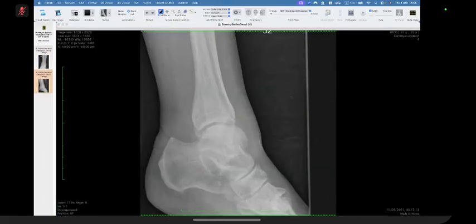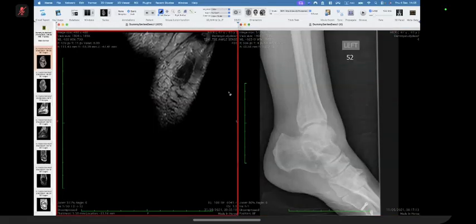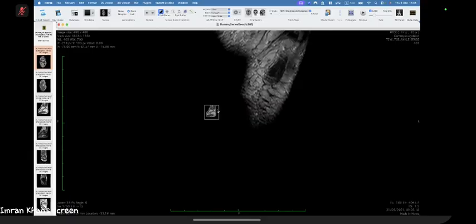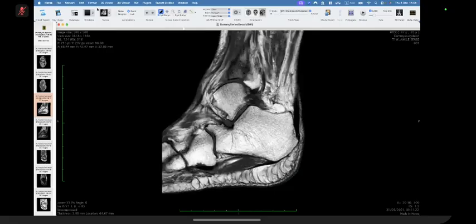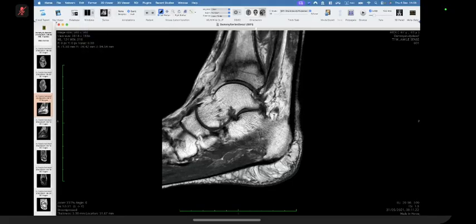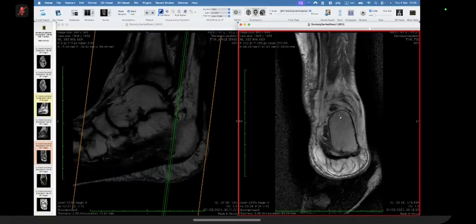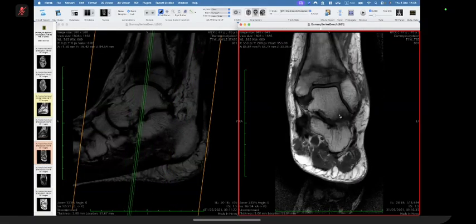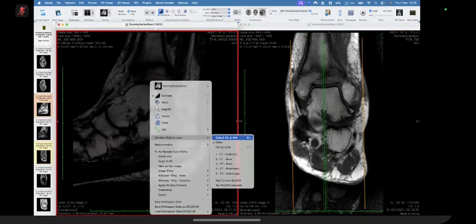So what's the next thing I did? I literally took her around, begged and pleaded and tried to get the radiographers to do an urgent MRI right then and there. What is the finding? Stress fracture. Correct. So this is a stress fracture. She's a 63 female. She's in a lot of pain. There is periosteal reaction there. This was a stress fracture.